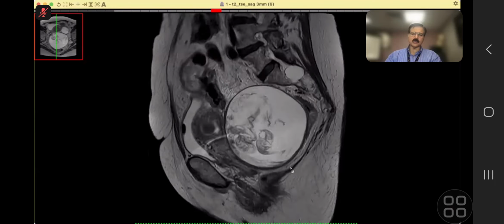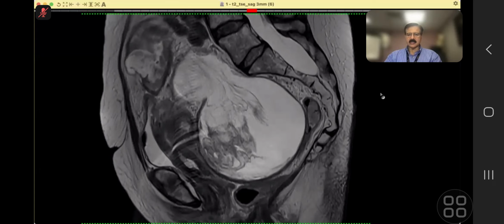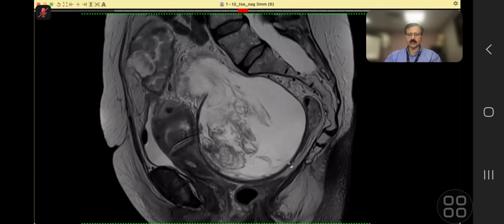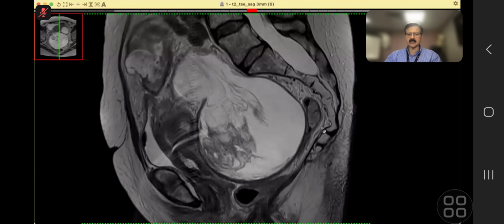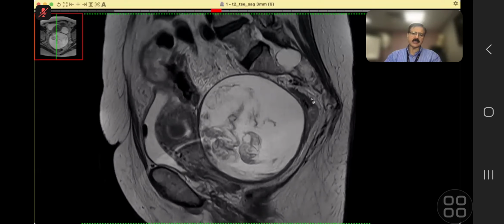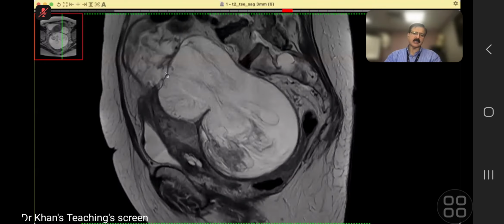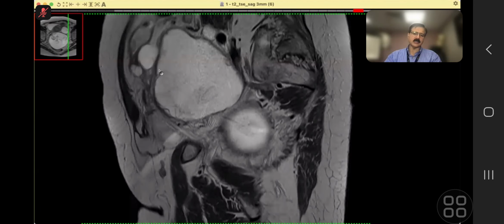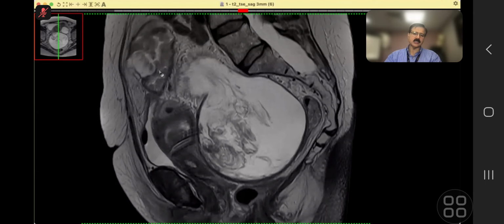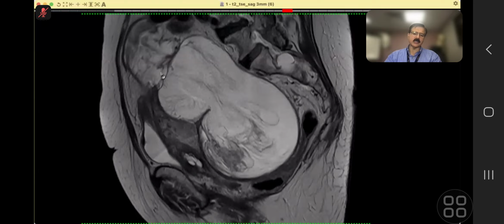But going back, actually, interestingly, there was a synchronous tumor here. Do you see this? There is a synchronous tumor sitting in the rectum. And with that, now you can see how it behaves and how it comes out from the parent organ, which is the sigmoid.